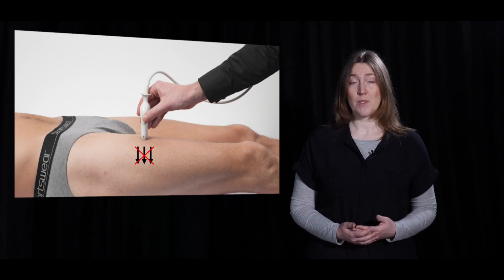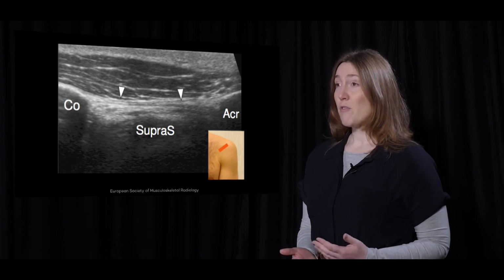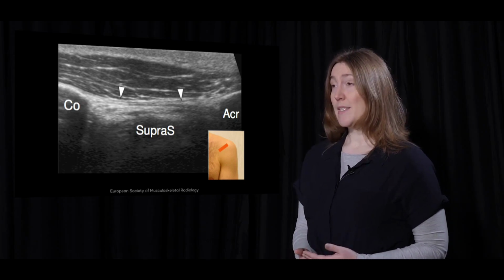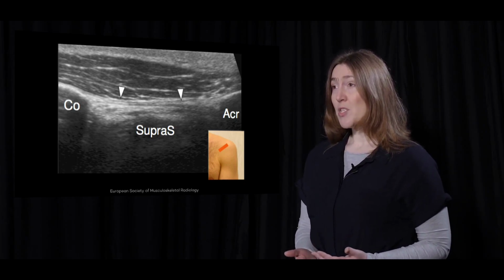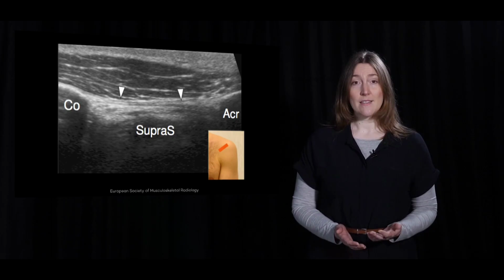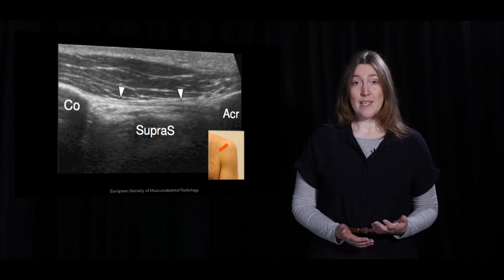In this image, you can see an example of quite a big ligament, the coracoacromial ligament. The ligament has been scanned longitudinally and its hyperechoic fibres can be seen. The ultrasound appearance of ligaments is much alike the appearance of tendons in ultrasound. However, there are a few differences, such as ligaments are less organised. Due to this, you will see that ligaments have less echogenicity than tendons.